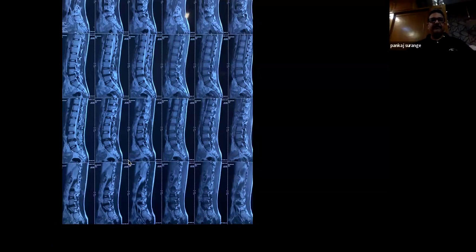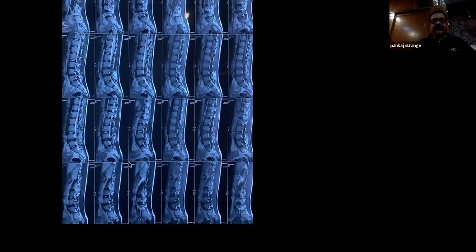Yes, it is sagittal, but look at the CSF here. The first three are T2, and this side is T1. They are sometimes provided together, just to compare within one film.